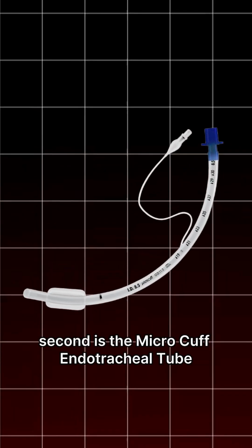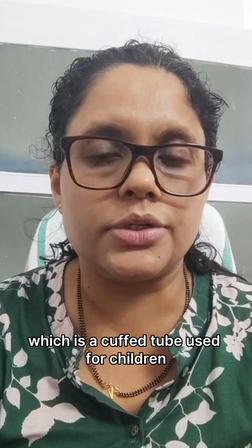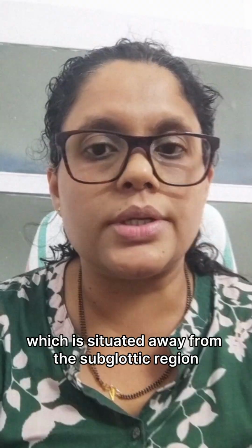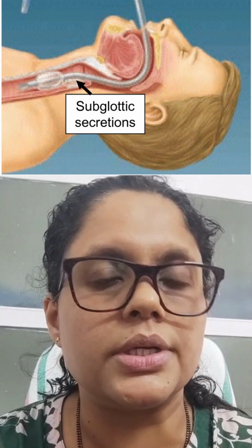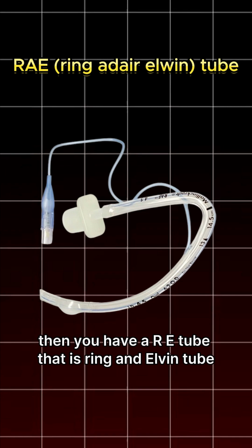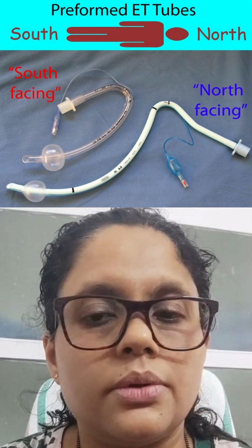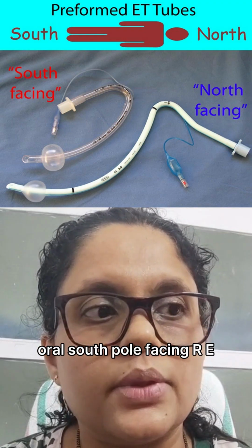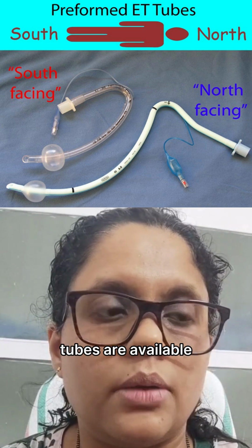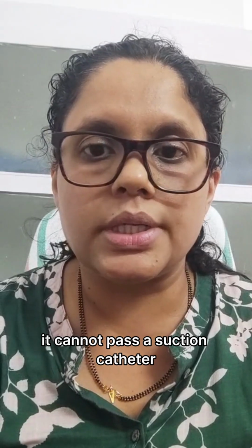Second is the microcuff endotracheal tube, which is a cuffed tube used for children. It has a soft urethane cuff, which is situated away from the subglottic region. It has no Murphy's eye. Then you have the RAE tube, that is the Ring-Adair-Elwyn tube. Oral south pole facing RAE tubes or nasal north pole facing RAE tubes are available. It cannot pass a suction catheter.